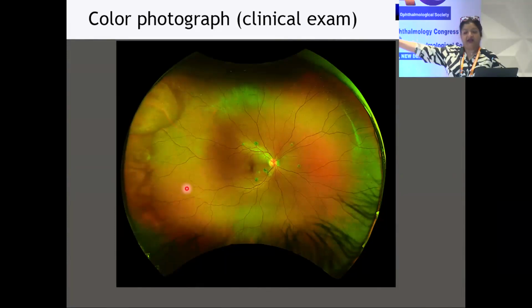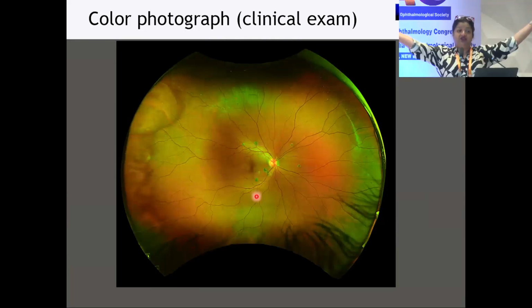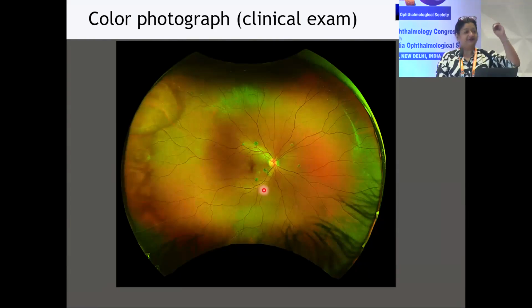This is a PIC. Now again, remember Dr. Thorne said, small lesions more in the posterior pole. Thank you for the pointer. And you can see here, small lesions, inactive in the posterior pole. I showed you a wide-angle Optos, so you can actually see that there are no other lesions anywhere else, but you can have it. But they're small, discrete, and pigmented, inactive lesions. If they're active, they're a little bit more fluffy, a little bit more creamy yellow in color.